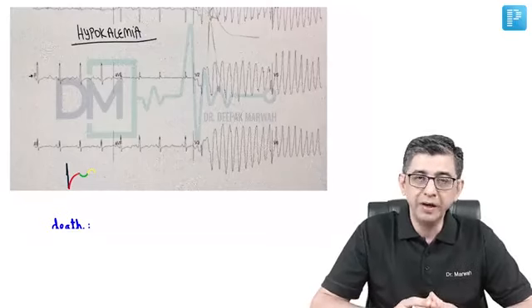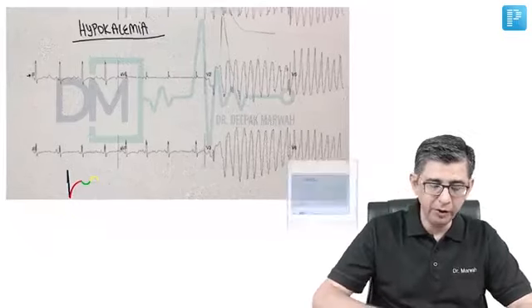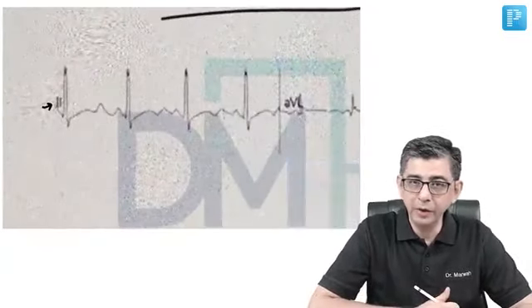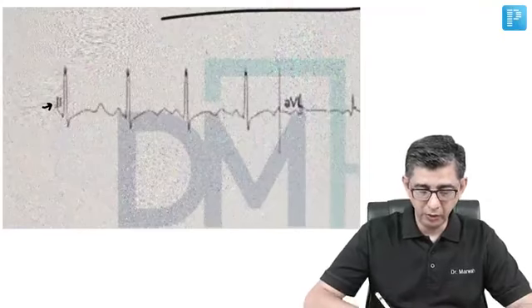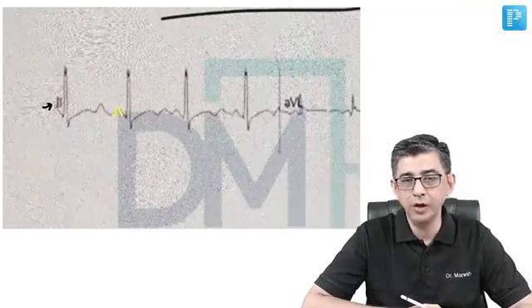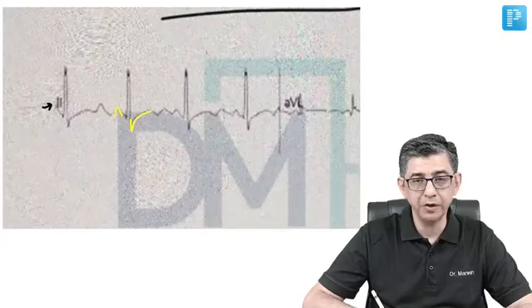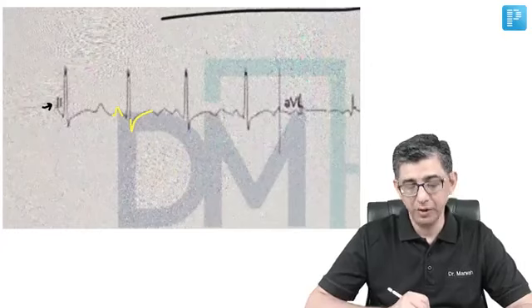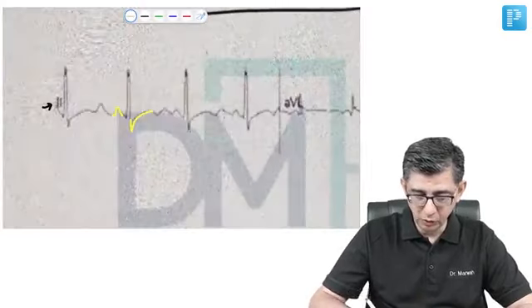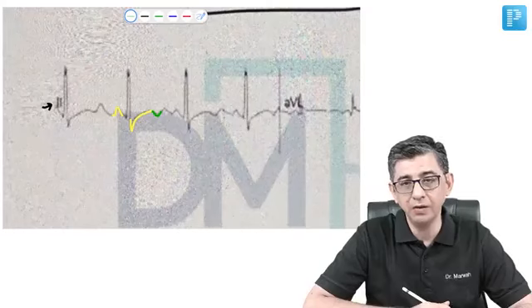We have learned the findings of hypokalemia, especially from the ECG perspective. I'll just zoom into this particular ECG where I have pointed towards lead number 2. What you can notice is a P wave which looks slightly taller than it normally should be, and then there is a visible ST segment depression. Once the ST segment depression is visualized, I'll do an ink change here to show that there is also concomitant T wave inversion. This in green is a T wave inversion.